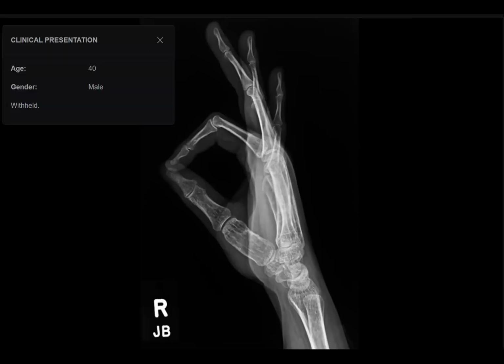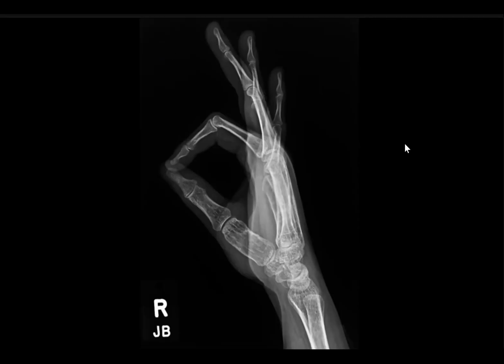So this is a lateral hand radiograph specific for some fingers, especially for the thumb, to make out the clear boundaries of it. It's a metacarpal bone, and it is showing an expansion. There is widening of the medullary cavity, overlying bony thinning. The trabeculae are thin but becoming prominent, and the remaining bones are showing normal.